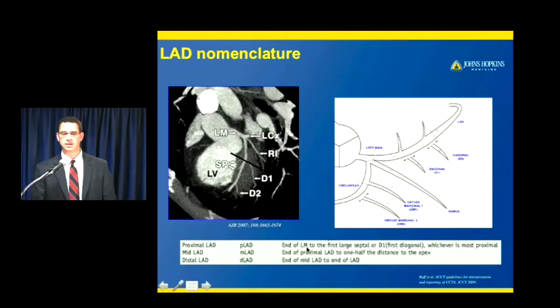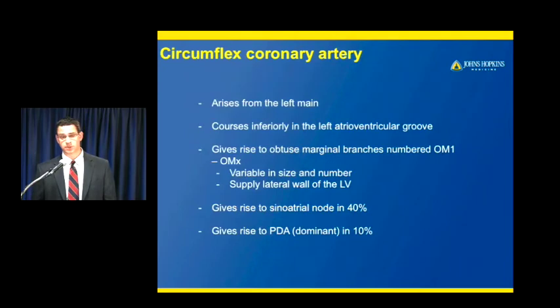The mid-LAD, though, is not defined by any branch distally, but rather it's the end of the proximal LAD to half the distance to the apex. So that's a little easier. Sometimes you end up with a very small proximal and a fairly large mid LAD segment, and then the distal LAD is halfway to the apex all the way to the end of the LAD, so that's easy to remember. Okay, so that wraps up the LAD.